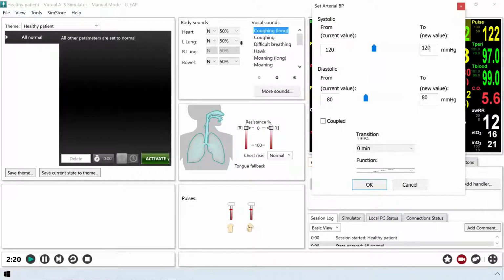One little pet peeve I have with this, let's say I do 135 and I want to go over 70. Pressing the tab key, I'm still stuck in this text box. I have to click into this to change it, or I have to just drag it, which is really obnoxiously annoying for me. Or you could just couple it and they all go up and down together. Let's just try to kill this person.